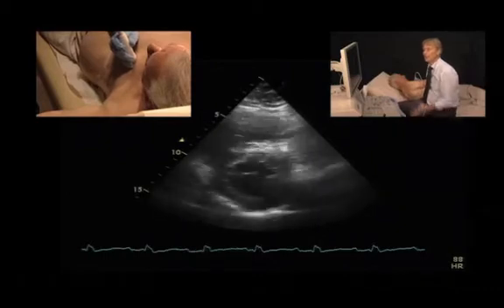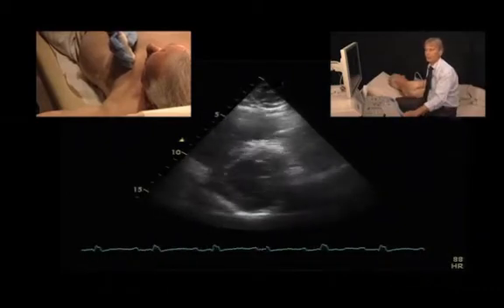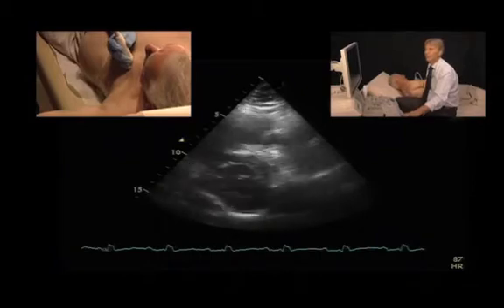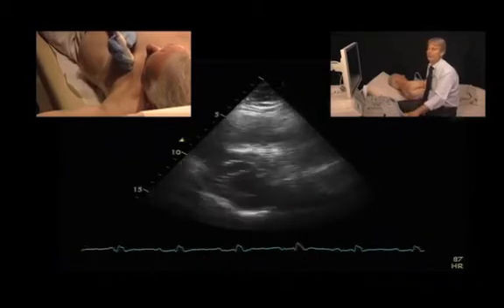Certainly, hypertrophy can also be asymmetric in patients with hypertensive heart disease, but this altogether looks very much like hypertensive heart disease. If you look at the clinic of the patient as well, and you know that the patient had hypertension for many, many years, the diagnosis is quite clear. Okay, so are you ready for the next case?